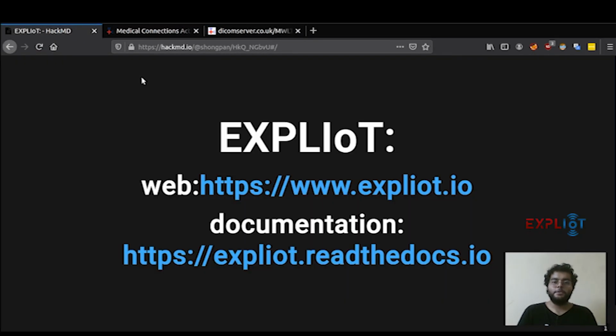So that was it for this video. I have shown you the C-echo and the CFind plugins, the DICOM plugins of the EXPLIoT framework.